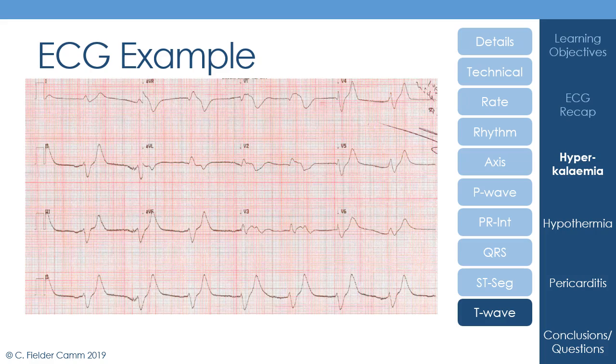I think it's hard to say that they're really tented T waves at this stage, but I think that they are very high compared with their base, particularly if you look at that rhythm strip. And so overall, here we have no clear P waves, but a regular broad complex bradycardic rhythm. And we have this broad complex with quite pronounced T waves that almost are looking sinusoidal.